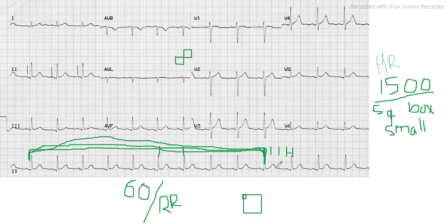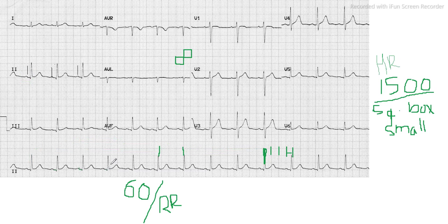So in this video what we concluded is whether it is normal sinus rhythm or not. So this is normal sinus rhythm, because the P wave in lead 2 is positive, and the PR interval is constant, and P is always preceding the QRS complex, and the heart rate falls under the normal range. So these were our findings.